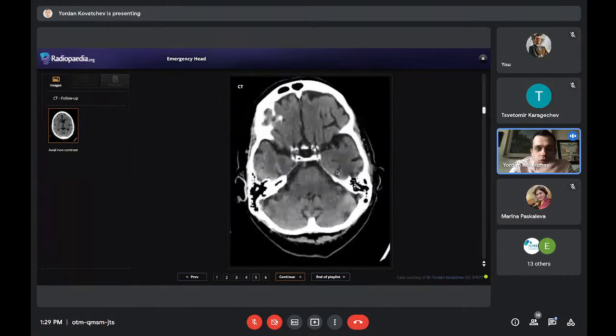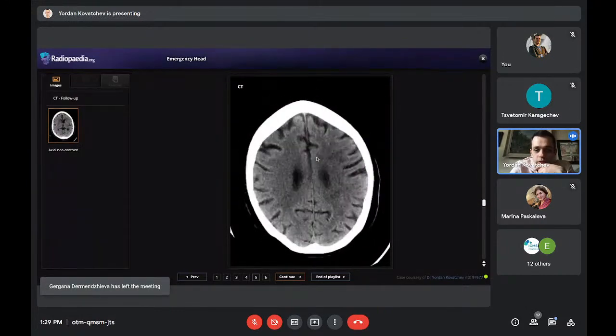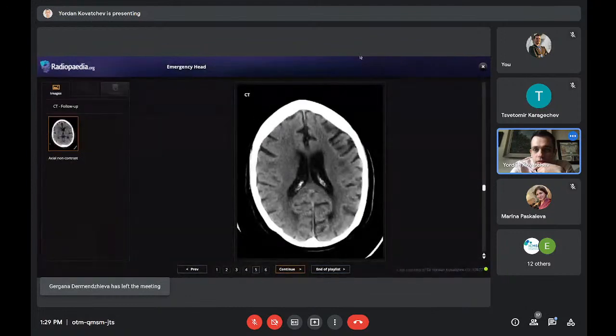Now, again, you're doing really well, by the way. If someone wants to say what they think is happening here, just one second, because my battery is almost dead, but it should be enough.